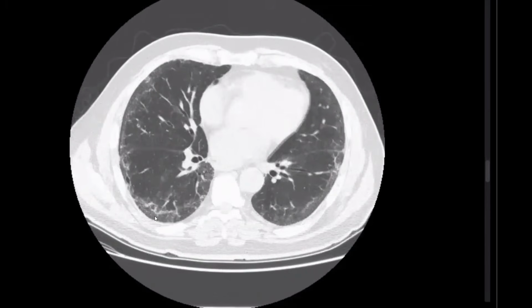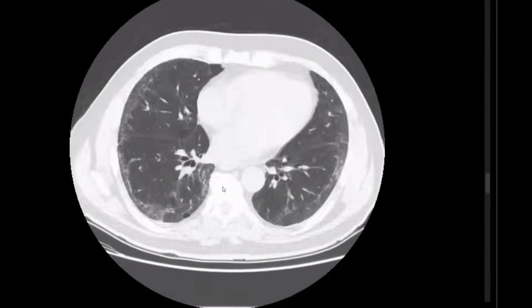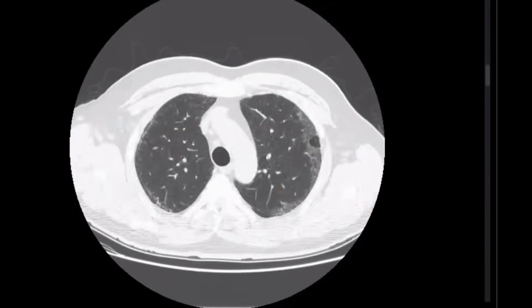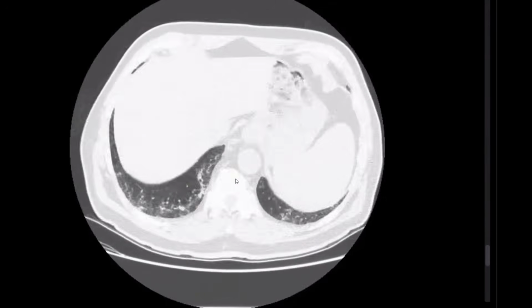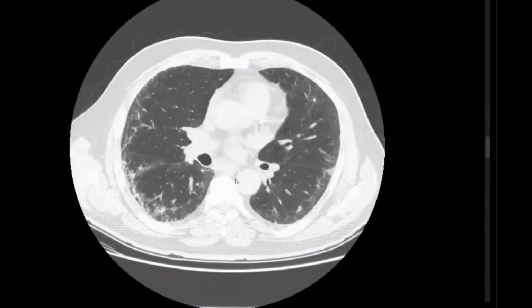In our routine practice, we should search for any signs of connective tissue diseases like dilated esophagus and also erosion of the clavicles and something like this. We will review this one at the end. Occupation, yeah, you are right. Okay.